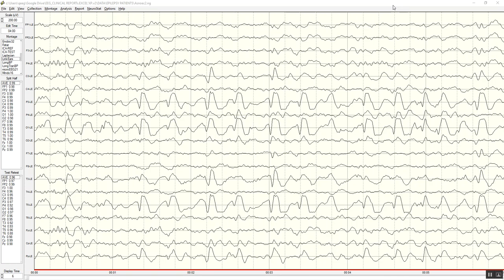This is a video demonstration of the new NeuroNavigator add-on and standalone program. The add-on is inside of NeuroGuide, which allows one to drill down inside the brain into a three-dimensional volume to look at the sources of the EEG and to evaluate and navigate through various parts of the brain, which I will be doing in a minute.